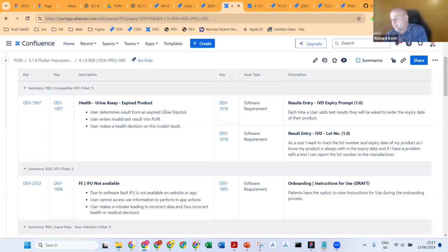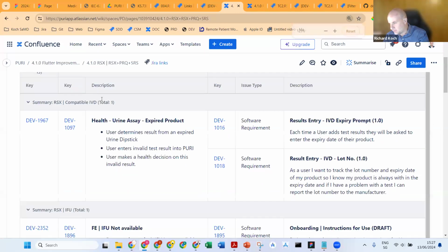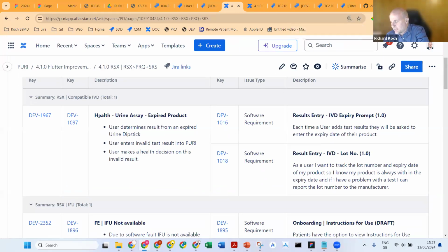So obviously, you need to make sure if a risk needs to be mitigated, it needs to be covered by a ticket with the mitigated by link type: requirement, spec, detailed design. That's okay. That shows you the coverage. But you really need to be looking at the detail of the risk ticket versus the detail of the linked ticket, so you can determine if it's a valid mitigating action. So for example, here, I'll just zoom in a little bit.